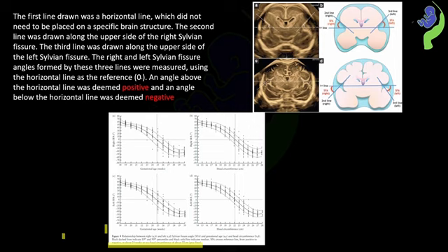The graph given here shows the nomogram for Sylvian fissure angle. An important observation is that the SFA crosses the reference line from positive to negative at around 25 weeks of gestation or when the head circumference reaches approximately 220 mm. At this time, the Sylvian fissure angle will shift to a more negative value.